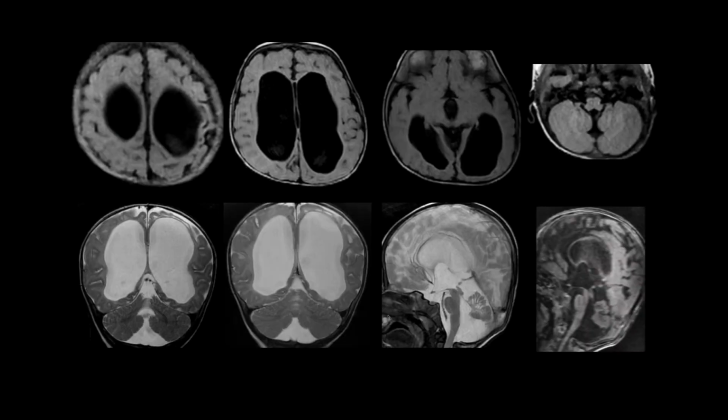The child was scanned at another center, and here you have the axial T2 FLAIRs. You can appreciate that this is severe lateral ventriculomegaly. In the left high parietal region, there is some loss of the cortex, or cortical thinning, with some areas of gliosis in comparison to the contralateral side. The ventricles are significantly dilated. The posterior fossa cerebellum is normal, at least on the axials, but on the coronals there is a hypoplastic appearance of the cerebellum, and the vermis is demonstrating some areas of atrophy and some T2 hyperintense signal changes.